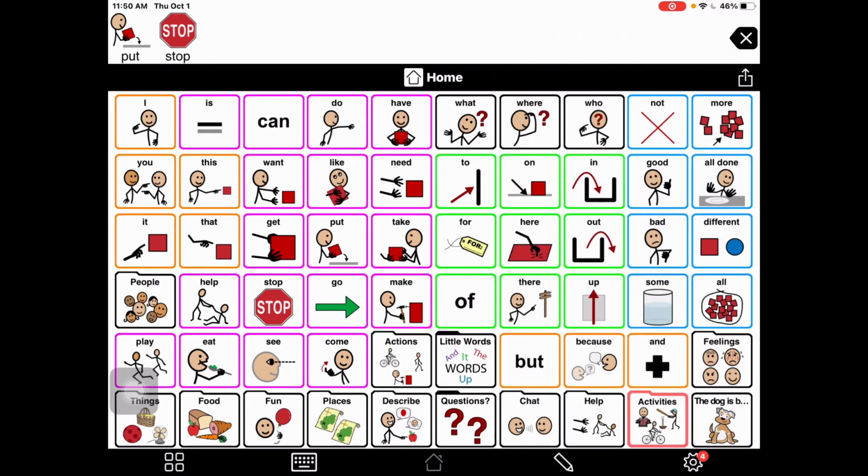So if I have this on, I'm going to select a couple buttons, and there's red rings around the button my finger's on. And when I release the first button, that's the one that's going to speak. And the other one that I was also touching isn't going to do anything.